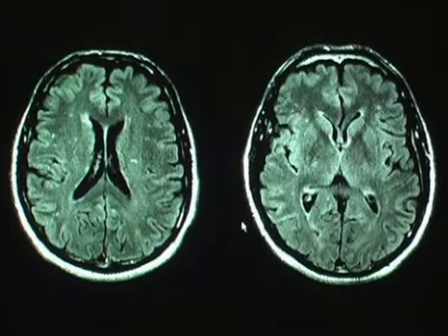It's a case of something which is more profuse, with multiple punctate lesions identified throughout the white matter. And this was a patient who had initially presented with the typical rash, or erythema migrans, of Lyme disease. And so this was a patient known to their neurologist as having chronic Lyme disease.